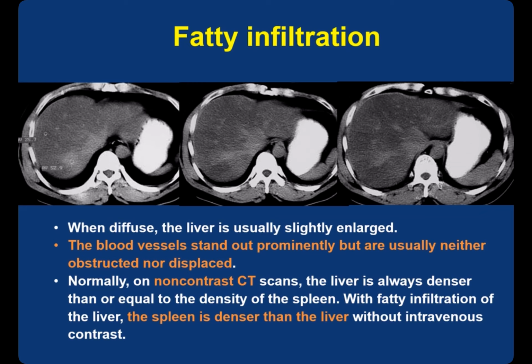The hallmark sign of fatty infiltration is that the blood vessels stand out prominently on non-contrast CT scans. We can see these three images are non-contrast CT scans, but the blood vessels stand out, and also these vessels are neither obstructed nor displaced.